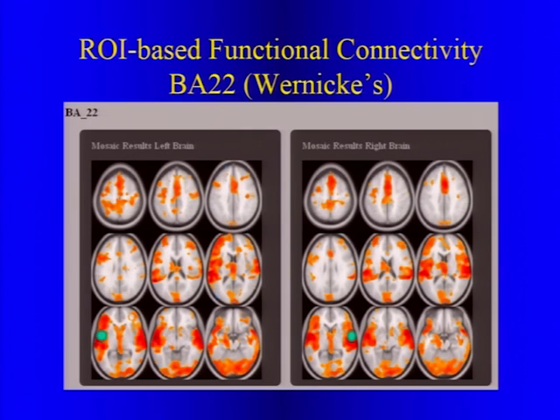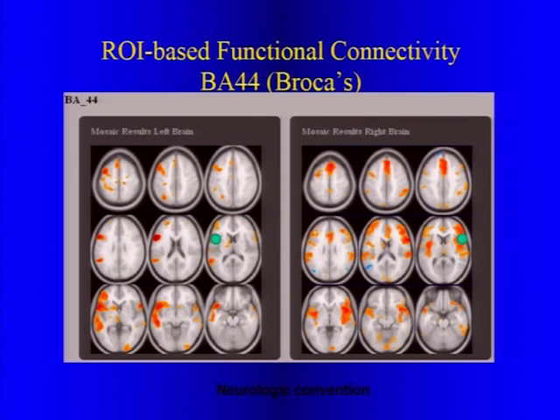So the implication here is that, in fact, we can perhaps, with resting state, be able to tell in a sedated patient what the dominant, not only receptive but also expressive areas are. We usually only get receptive when we do our sedated patients. Again, just the opposite. We've done the same thing looking at Broca's region on the right, and this is the patient's left, and this seed point shows on the left the activation in receptive language seeded from Broca's, and not on the right.